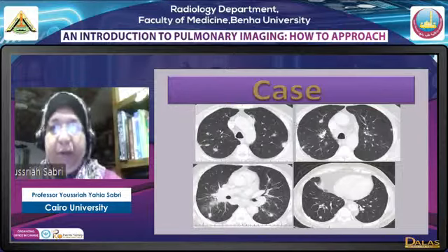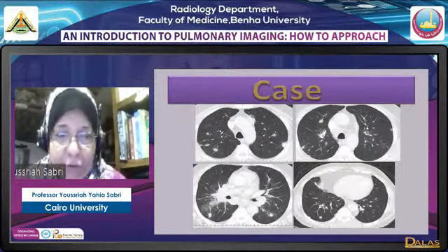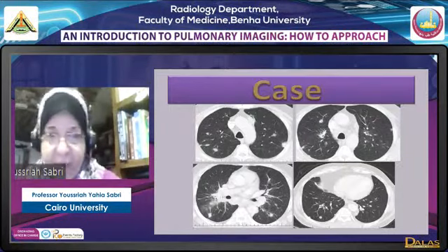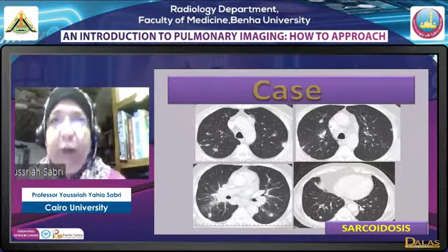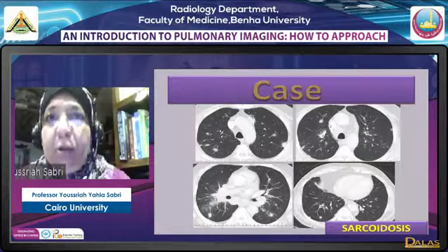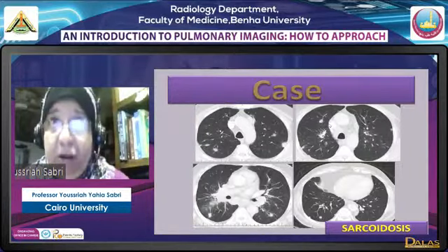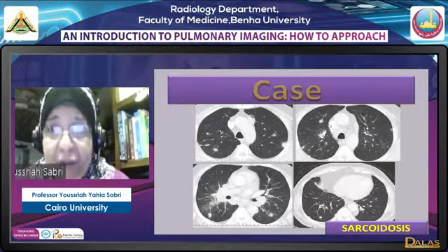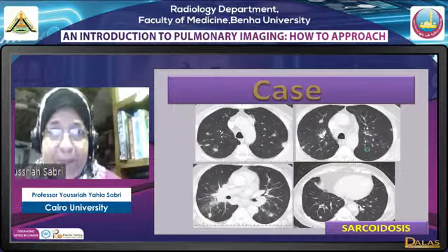Going to have another change in morphology. Instead of the well definition of the lesions, we have nodules which are rather irregular and some of them ill-defined. In addition, we have perihilar opacities and hilar fullness. This is a case of sarcoid. So when we have nodules that are not sharply demarcated, we will consider the possibility of inflammatory or infection, and we will not consider metastasis mostly.